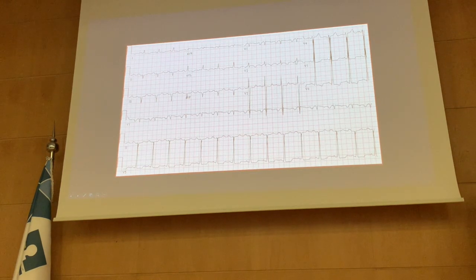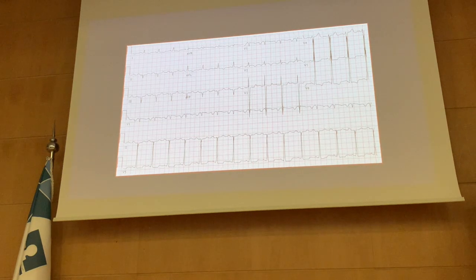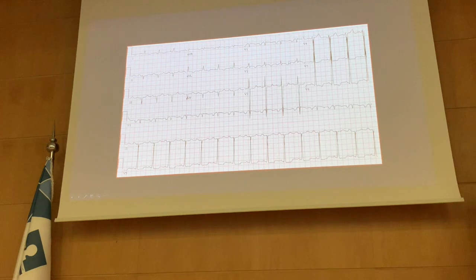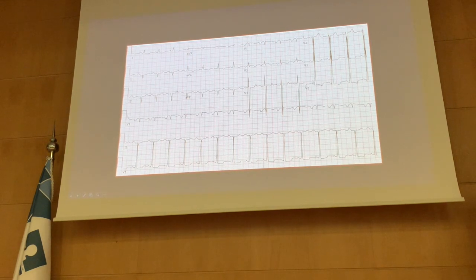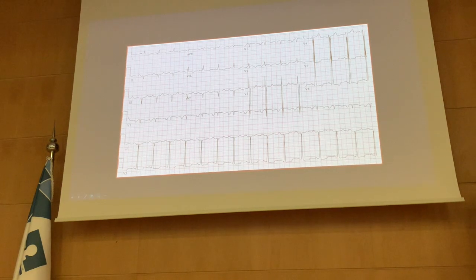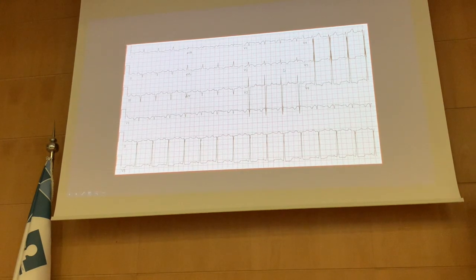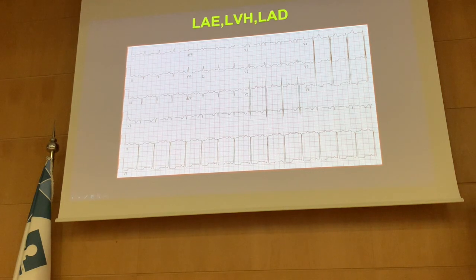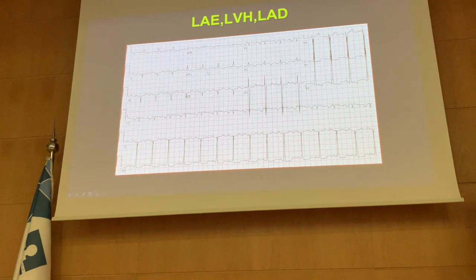Sometimes with atrial enlargement, you will be confused. Which one is the P wave? Which one is the QRS? But alhamdulillah, you are okay. So what do you think about the ventricle itself? Okay, very large. Yes, good. So this patient has complex disease. He has atrial enlargement, he has left ventricular hypertrophy. So this is a combined disorder.